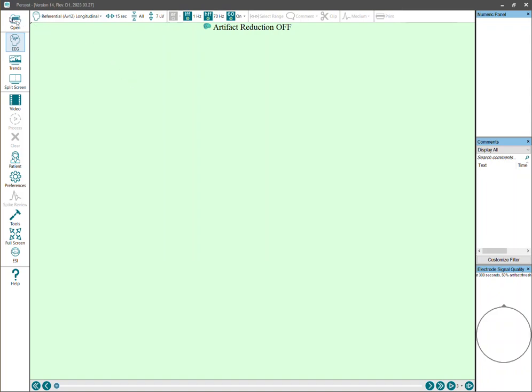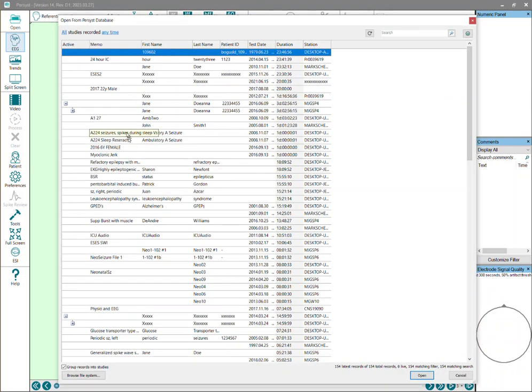My name is Michael Guest, VP of Research and Clinical Applications for Persyst. And I just opened the database. This allows you to set one or more file locations of one or more different file formats. You can do multiple file formats at once, and then have it index the files so you're not selecting them by browsing through the file explorer. You can actually bring up a list of patient recordings and click on them. These are training recordings, or part of our EEG teaching library.